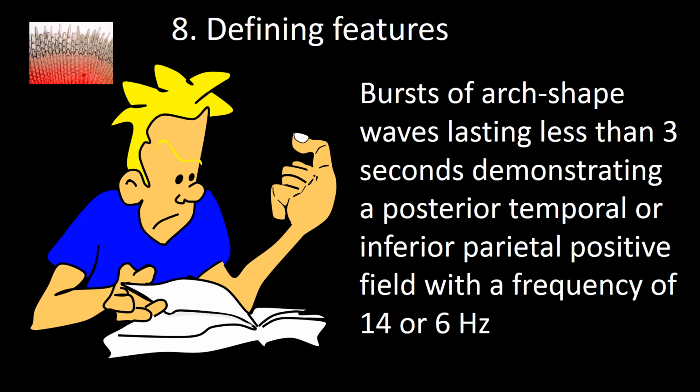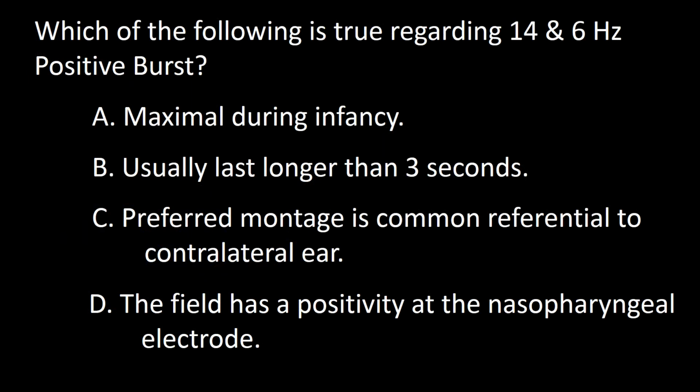Their defining features are their bursting quality, their short duration, the posterior temporal parietal positive field, and their frequency. So the answer to this question is C.